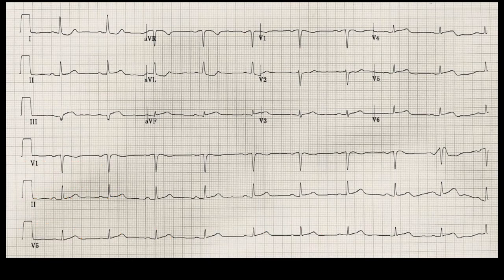In this one, we mentioned before that there seems to be some changes. Here we look at V2. That looks pretty much okay. In V1, no obvious things there. V3, no obvious ST elevation or T wave changes. V4, starting to look a little funky there, but not too awful bad. That ST segment where that cursor is might be a millimeter or so above the TP segment there. This one, not as convincing, but it's a little bit wandery, so hard to say.